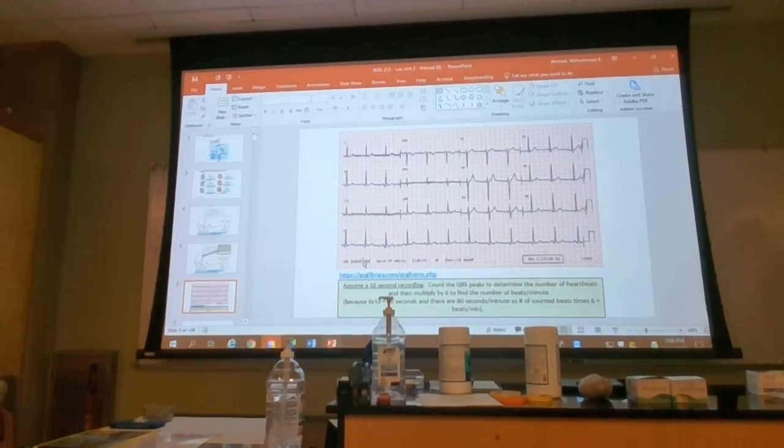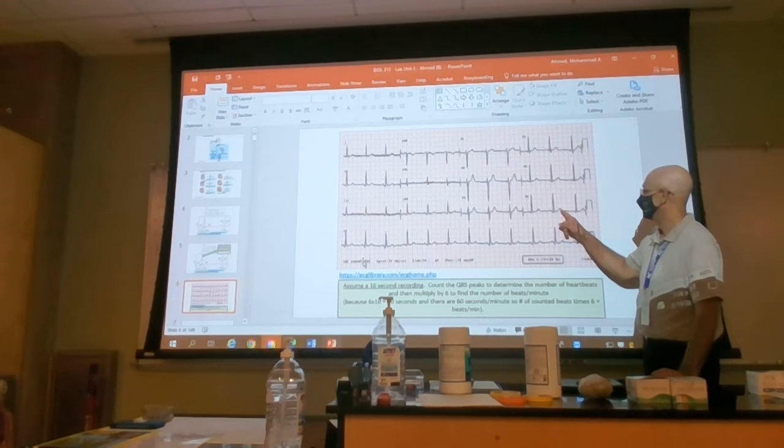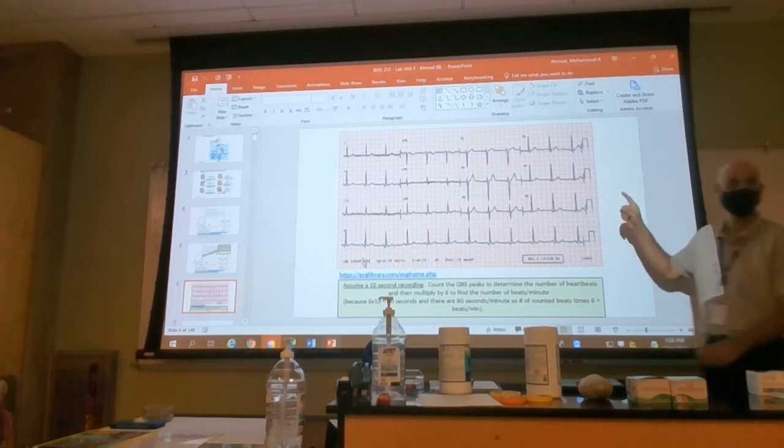You know all the waves, guys, here? So on the exam, if it is pointing to this wave, what is this wave? T wave. What is this called? Big wave? QRS. So what is this one before it? P wave. Yes. And what is this interval from P up until here? That's the PR. And what is small interval between here? That's the ST segment. You should be able to tell all these from a graph.